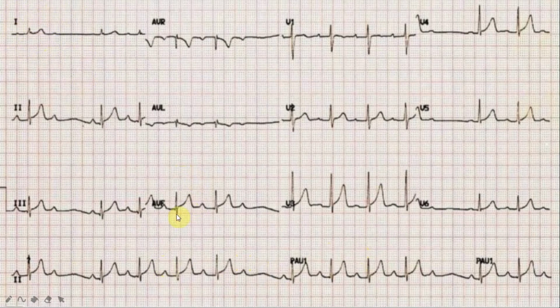The P wave is normal and the PR interval progressively prolongs, followed by intermittent non-conducted P waves. For every 5 P waves, we have 4 QRS complexes. Therefore, there is a 5:4 Mobitz type 1 second-degree heart block. The QRS complexes are narrow complex and irregular. The ST segments are isoelectric. The T waves are normal.